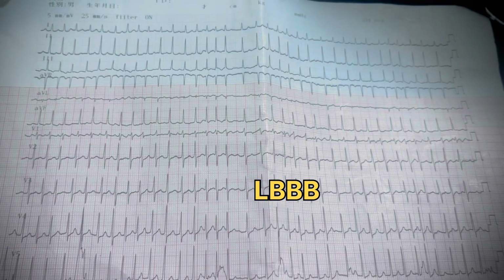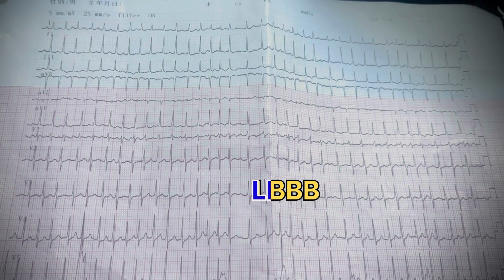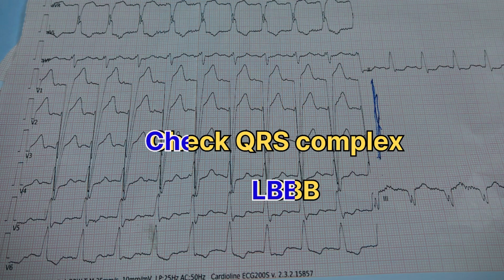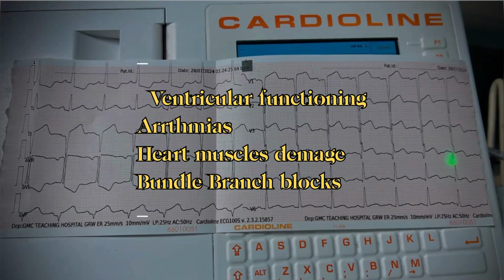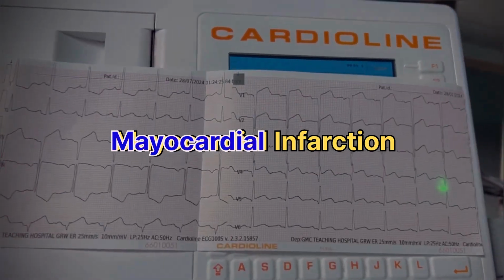Next, we'll examine the QRS complex. The QRS complex should be narrow and within the normal range, that is 1.5 to 2.5 small squares on an ECG. If it is wider, it could indicate a serious problem like left bundle branch block. It's really important to check the QRS complex because it indicates ventricular functioning, arrhythmias, bundle branch block, or some kind of myocardial infarction as well.